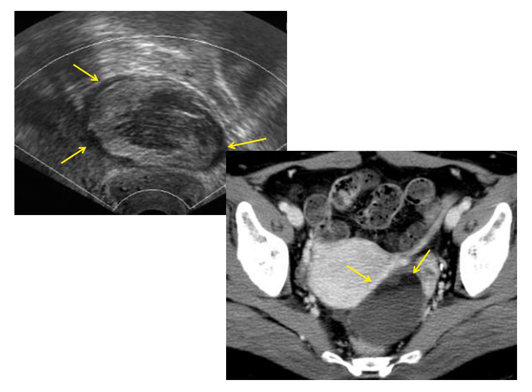Here is another case of a solid-appearing mature cystic teratoma with the same finding of a peripheral anechoic layer, and the CT shows that this layer is fatty fluid in this case. So this peripheral fluid can be either fatty or non-fatty fluid.